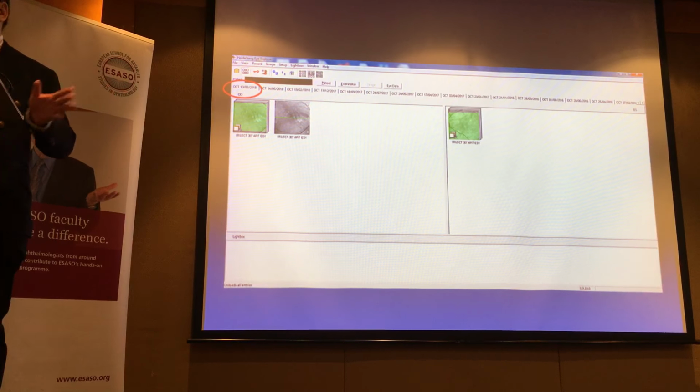And if I had just relied, so sometimes I will, especially in a busy clinic, if the person is experienced, I'll say, okay, so you examine, you don't find anything, OCT scan looks okay, fine, let's go. But I happened to look at this, and what did I see? Something below the cut. Remember I mentioned if it's outside the range of your OCT scan, either laterally, vertically, or height-wise, you might miss it. There was something dark here, with a kind of a straight line and then a bit of a boat shape. Patient had a pre-retinal hemorrhage.